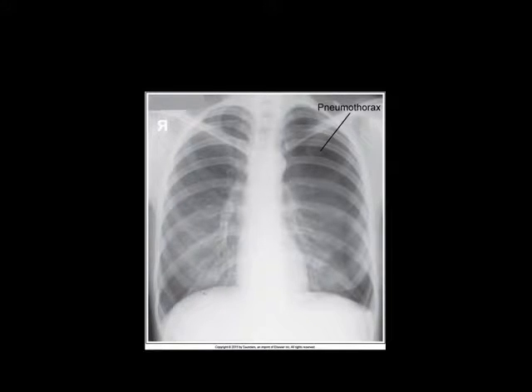So we are seeing sternal ends, more or less. I see a little bit more of this one on the patient's left than on the patient's right. I see air in the trachea, more or less midline. I'm guessing the vertebral column is right about here, and I have about equal distance from either side. I'm at about the level of T7. So I think I'm looking at a PA chest x-ray, with minimal rotation. I point out there's just a little bit of difference between these. Look at how it's diminished the size of the heart.